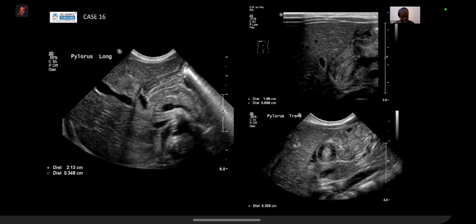So we're going to move on to the next case. I don't know if I'm switching candidates or not, but maybe I'll give this last one to candidate 3 and then we'll change. So do you want to have a go at this case, candidate 3?